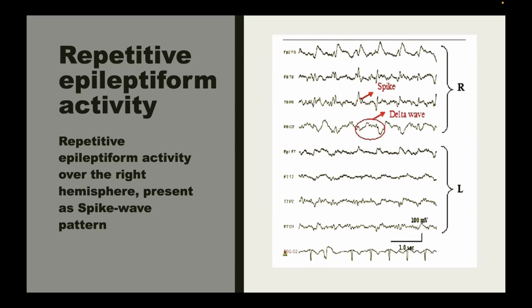So we should focus on the history, and we should monitor the patient with such epileptiform discharge by video monitoring. We cannot judge this discharge as an ictal event if the patient has no clinical correlation.